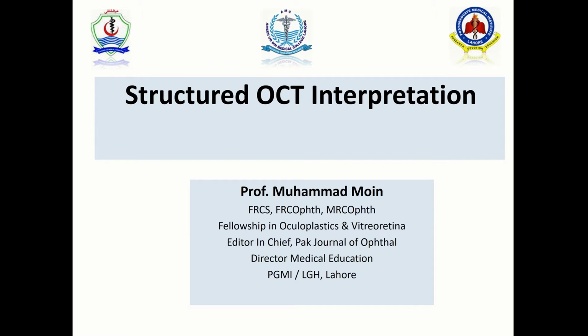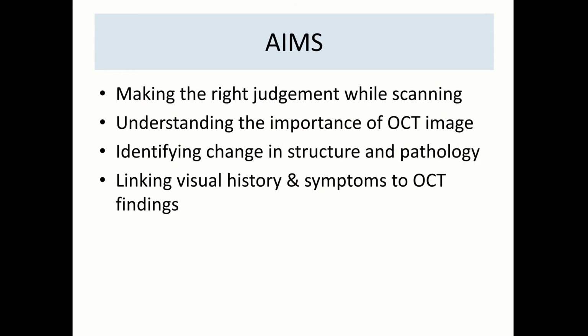Welcome to this lecture on structured interpretation of the optical coherence tomography. The aim of the lecture is to make the right judgment while scanning an OCT scan, understanding the importance of an OCT image, identifying change in structure and pathology, and linking visual history and symptoms to the OCT findings.